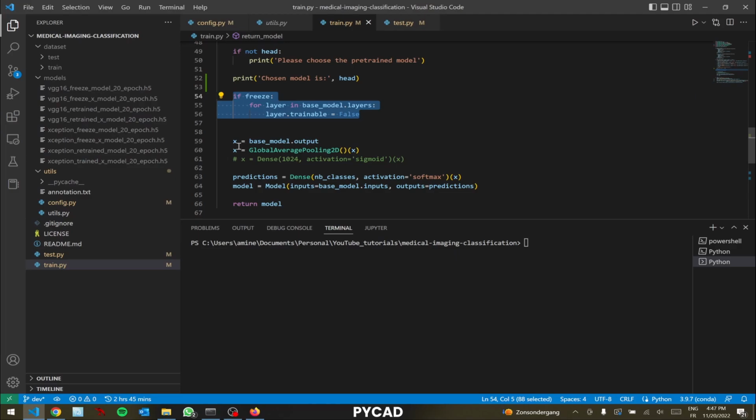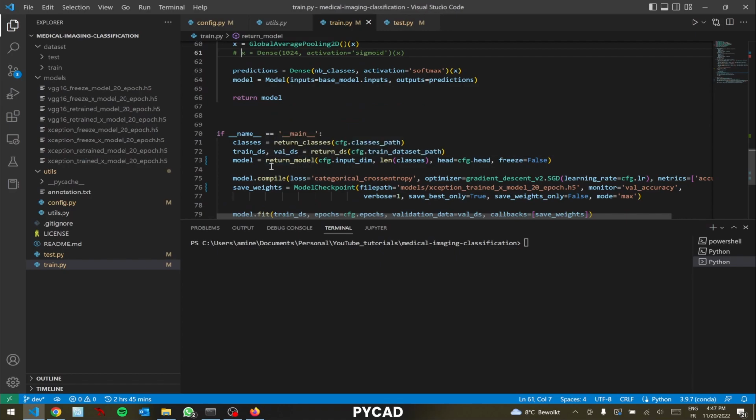But now let's talk about this part here, which is adding an additional fully connected layer, or not adding it. As I told you, if you need my recommendation, I would preferably not add it, but in some cases, and you will see in some points, adding it may help, but not all the time. You should always test with it and without it. But most of the time, you will get better results without this additional fully connected layer. Now, let me go to the training part.